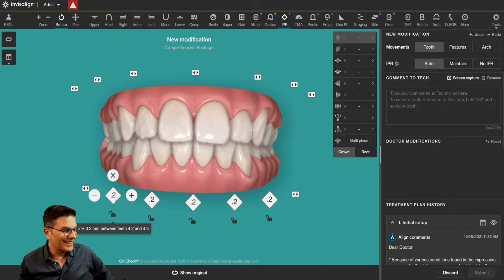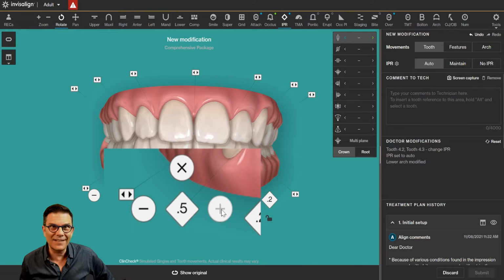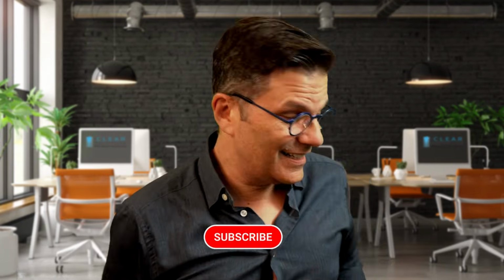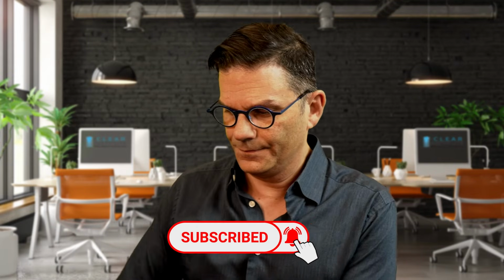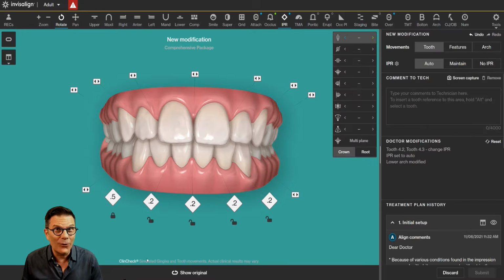But now let's say I want to put more than 0.5. I just go on the plus sign here and I put 0.3, 0.4, 0.5. I want to put more. There's just nothing I can do. Or is there something I can do? Yes, there is. And this is what I'll show you right now. Now follow and look at what I'm doing.